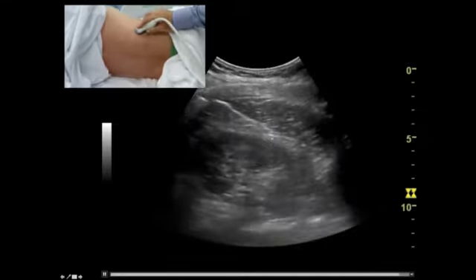Now normally the collecting system is collapsed and so you don't see any black right in the middle of the kidney, but if there's some obstruction, which can be physiological, like in pregnancy or patients on diuretics or patients with very full bladders, then you do see that collecting system in the middle. Now in this particular picture you don't see the nicely cupped minor calyces. I've ad-libbed a little with my diagrams, but certainly you get the general picture of what the kidney should look like. And you'll get used to that time and time again.